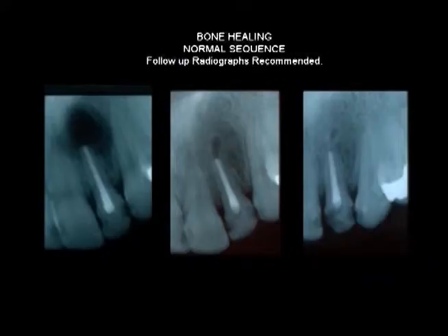Keep in mind at all times that bone can have various patterns that may mimic rarefying osteitis. You see here an example of normal healing bone. This tooth has been treated, an apicoectomy has been done, and one can see a radiolucency that may be suggestive of a granuloma, or since it doesn't have a cortication, an infected cyst, and one may proceed to treat further.